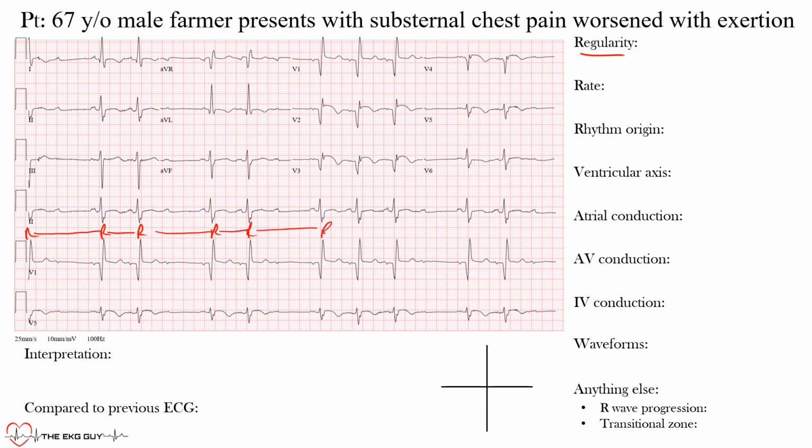Okay, and then you have another R wave, another R to R interval, and you can see that they vary in duration throughout. Okay, so this is an irregular rhythm, but because it's irregular, you may also notice that some of these are kind of grouped together. There's two here, 3 here, 2 here. Okay, so not so much regularity to it, so we would still call this an irregular rhythm in terms of the R waves or QRS complexes.